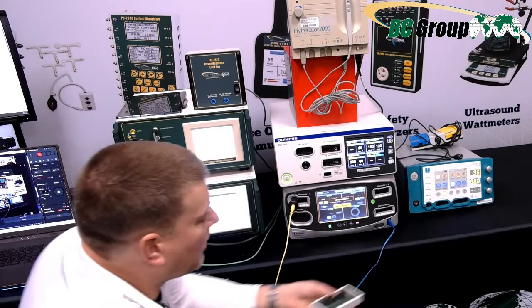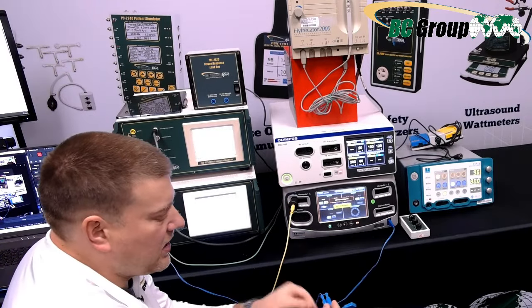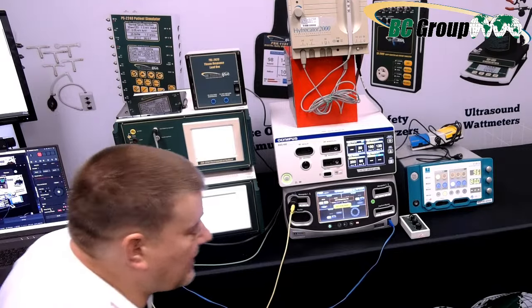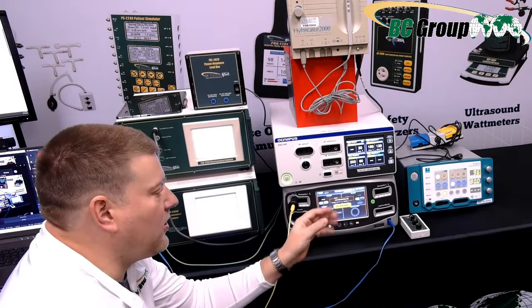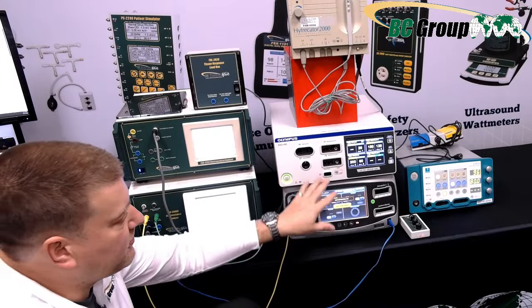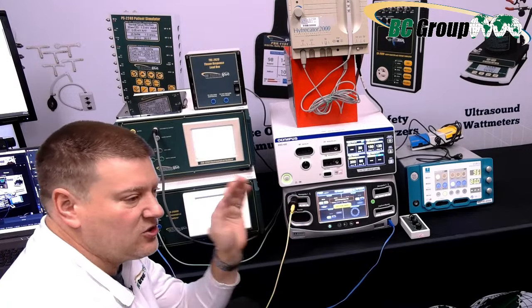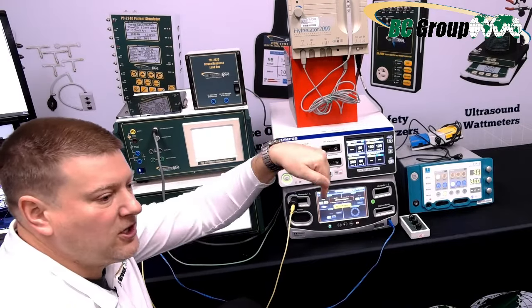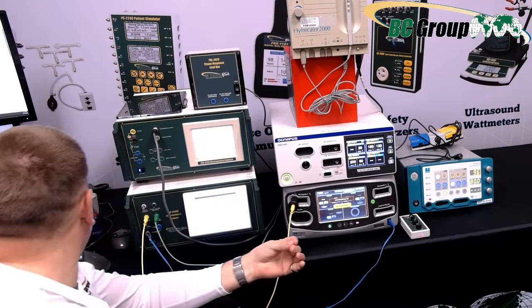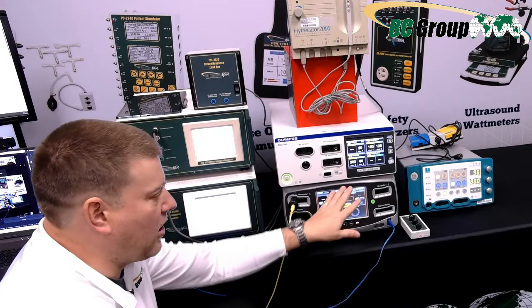Okay, so CQM, REM, depending on what year of ESU you're working on, it's all technically the same thing. It's technology for measuring resistance and making sure your unit identifies that your pad is peeling off, and that as the resistance changes, it changes its output. A normal output for an ESU will look like a curve. It starts out low, and as the resistance meets the sweet spot, it's at the peak, and then there's a falling off point. The resistance gets too high, which represents the pad peeling off the patient, and it attenuates and kills the amount of output from the generator.